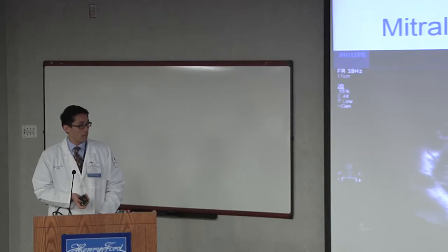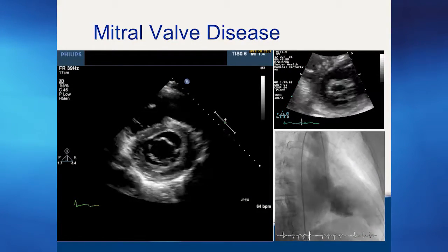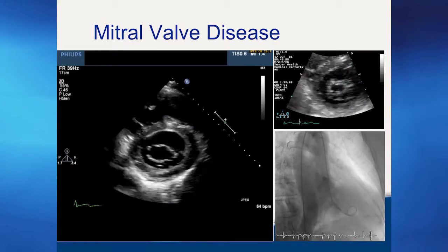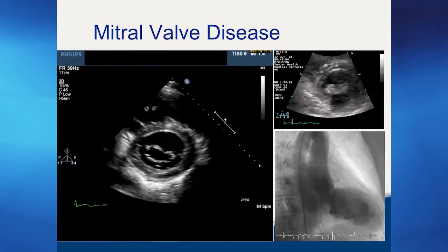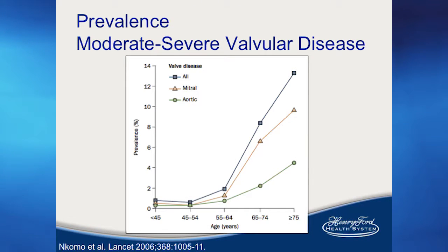This is the mitral valve, and basically, when we talk about valves, they either get stuck, they leak, or they do some of both. You can see that the screen on the far left is the normal mitral valve, and on your far right is a stenotic valve. That's a rheumatic valve, and there you can see a ventriculogram where the valve leaks. So that's what we're talking about.